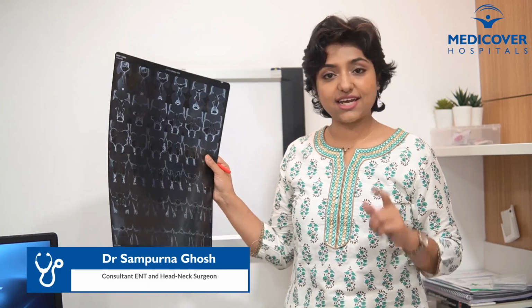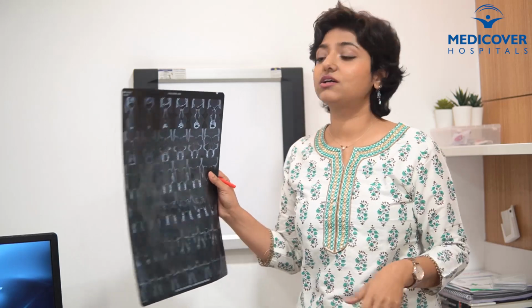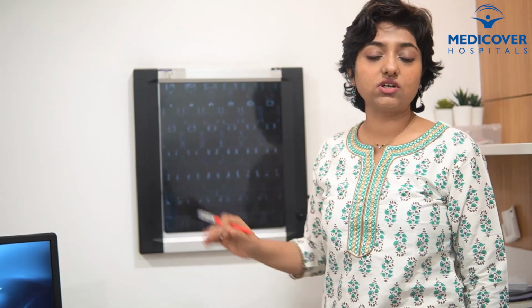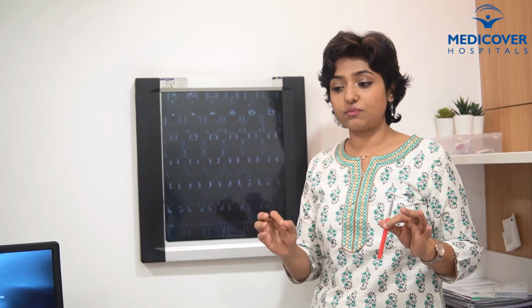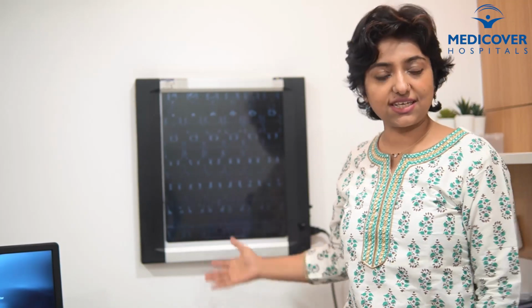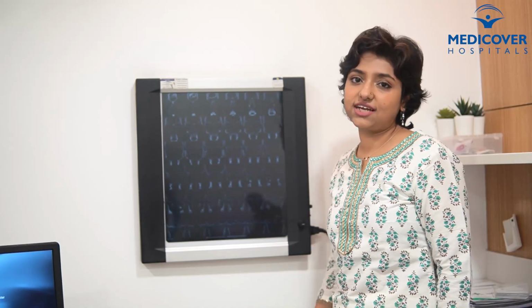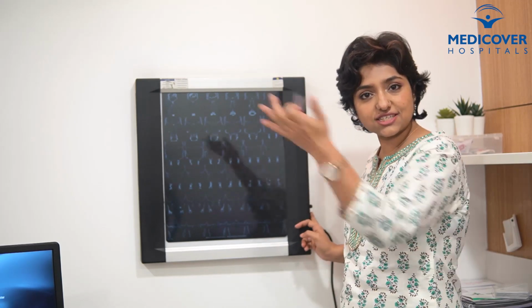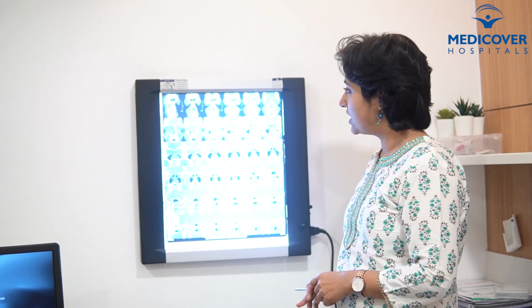Today I have a CT scan in my hand. I am not a radiologist, I am an ENT specialist, but why did I take this? Because I want to explain to you what a sinus scan is. When we ask for a CT PNS for a patient with nose block, sinusitis or another reason, what are the things we see in this and how do we decide the treatment course? Just a simplified view of that. So let's shift to the CT scan now.